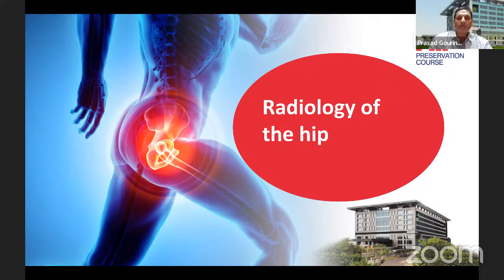This is one of my favorite topics, discussing radiology of the hip. When you say radiology of the hip, it's radiographic analysis of the morphology. We're not talking about tumors. We're not talking about any pathology here. It's basically the morphology. And I'll mention a few variations of the morphology that can become pathological to cause what's called mechanical pain. Again, we're not talking about AVN, bone marrow edema syndromes, tumors, lesions, or fractures. It's normal morphology and variation that we can pick up on plain radiographs.